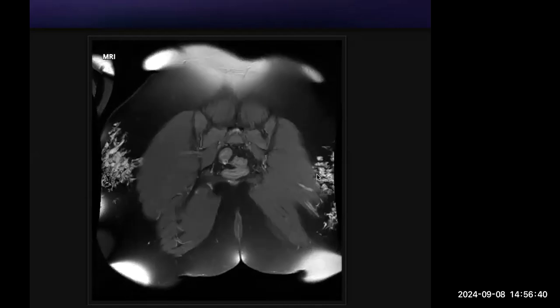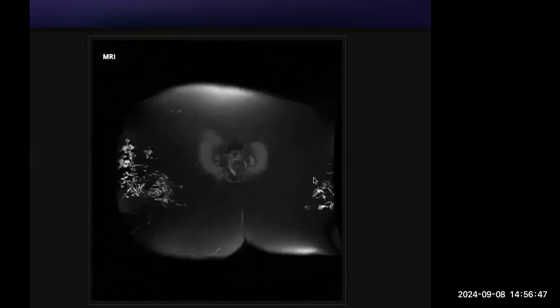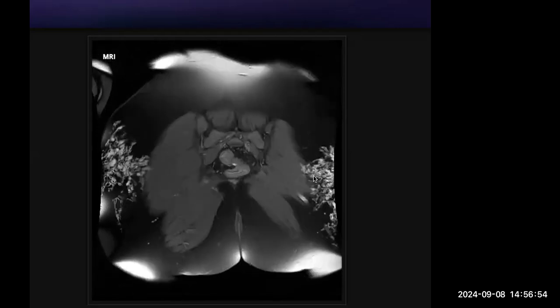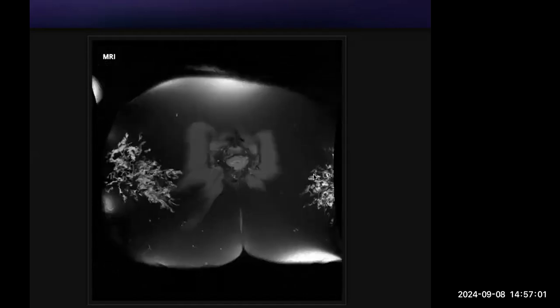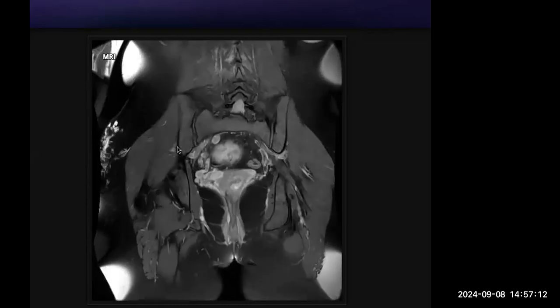The patient is complaining of left hip pain, right? Correct. So what would you like to do next? I would like to get a proper history of any previous similar illnesses, and I will do an ultrasound just to see what the contents of this lesion are, or any other more information I can derive. Okay, thank you.